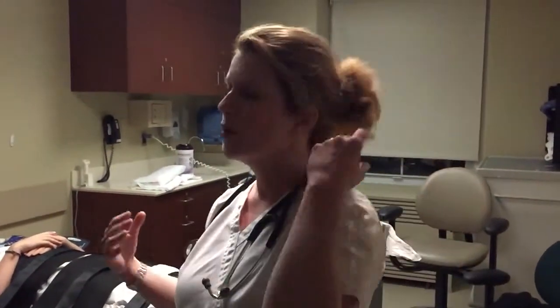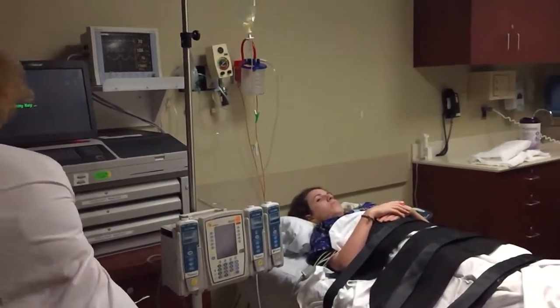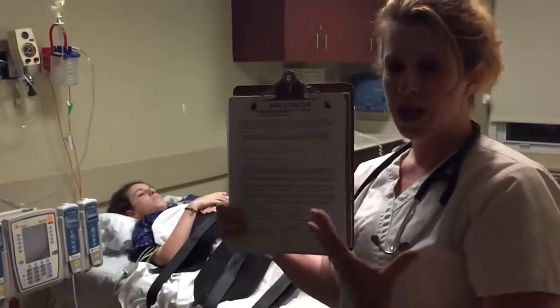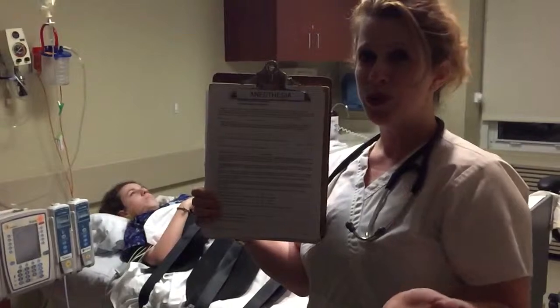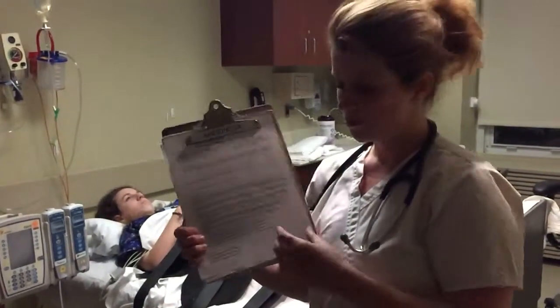What do we have to do before we do a tilt table test? Well, first, the patient has to be NPO, or nothing by mouth, for 6 hours before the procedure, just in case they get nauseous, we don't want any vomiting. The next thing is the patient needs to bring in a prescription from their doctor that clears them for this test. Another thing that we have to do is get informed consent. We want to make sure that the patient is knowledgeable about what happens pre-procedure, during the procedure, and post-procedure, because it's all about patient education.